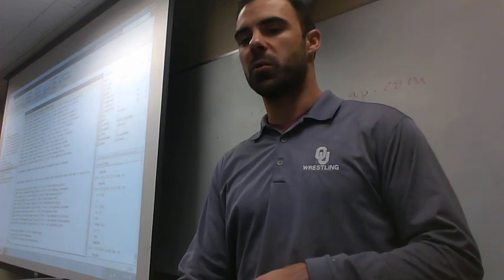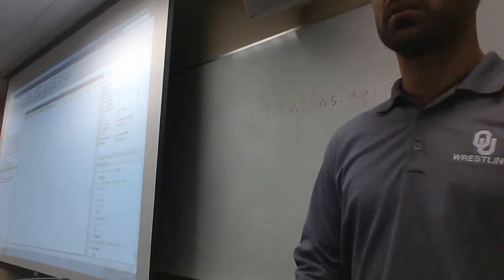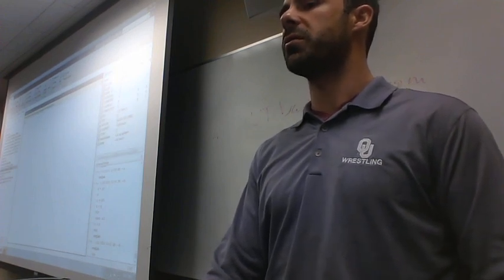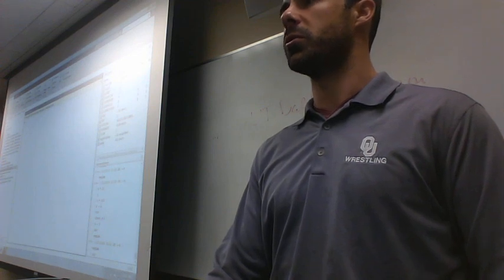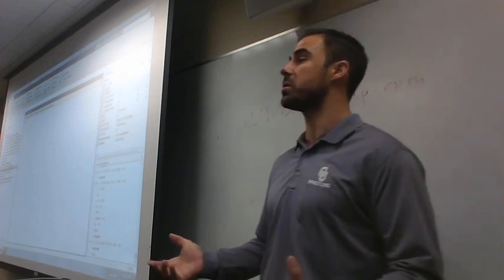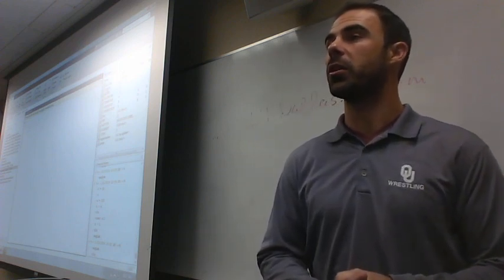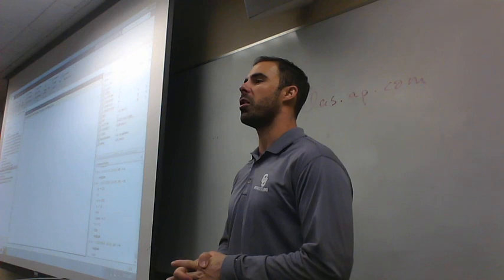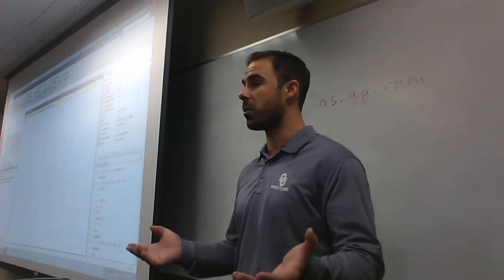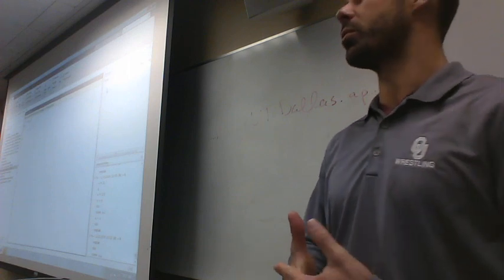Okay? So you can watch what I do, you can do it with me if you want. So if I'm in my command window, let's just say I type in CLC. It cleared my command window, but all of our variables, that's what we call this stuff here in the workspace. We had a bunch of variables, sort of like an algebra equation, because that's kind of what MATLAB is doing. It's doing math equations on matrices, and so some of that involves some algebra, so we call it variables. So all of our variables are still in the workspace, but let's say that we're like, oh crap, we screwed everything up. I just need to start all over. You want to clear everything and clear all. So if I type that in, now that clears out the workspace too.